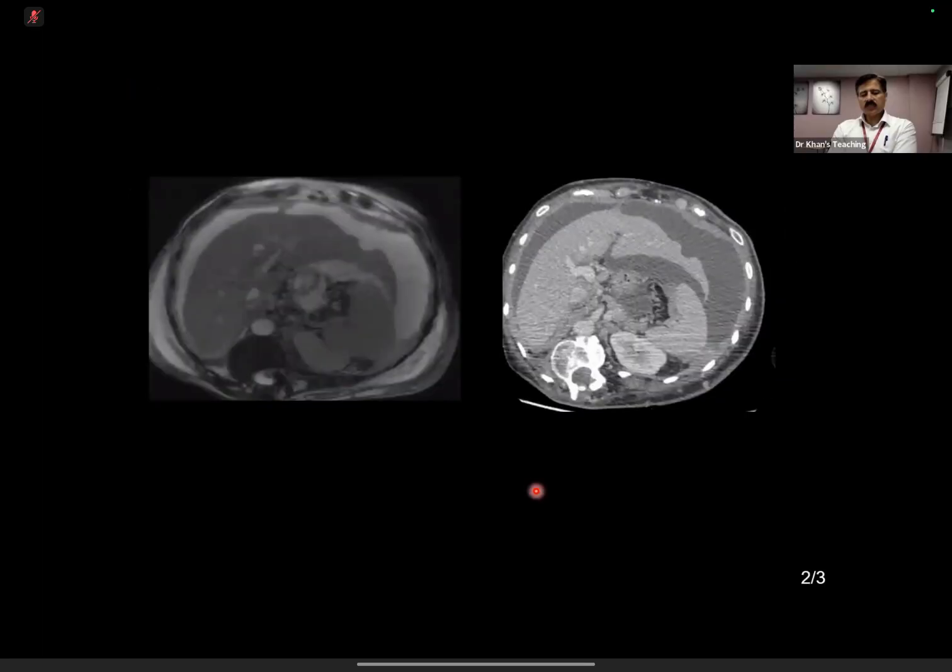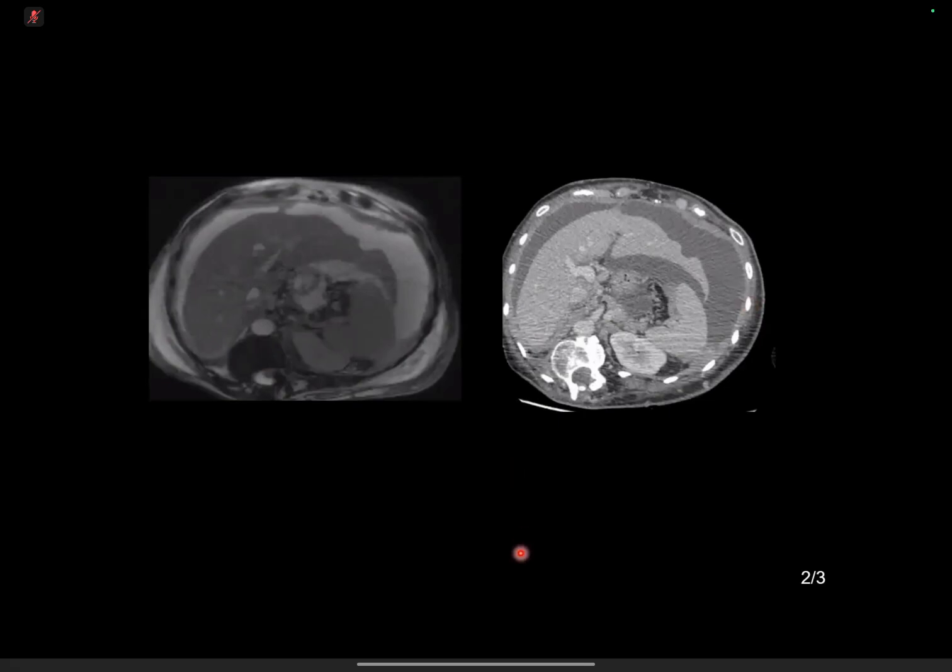So this is a CT scan of the similar anatomy, so what you saw on ultrasound, and I'm also showing you a T2 weighted sequence. So with this appearance, what comes to your mind? You are absolutely right, this is scalloping, but I just wanted to listen to a word there. Basically, how does it happen? Because you see, the argument is that there is nothing sitting there, no soft tissue or any mass sitting there.